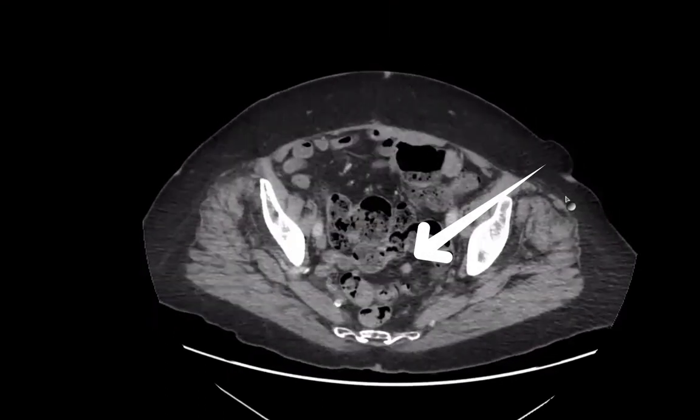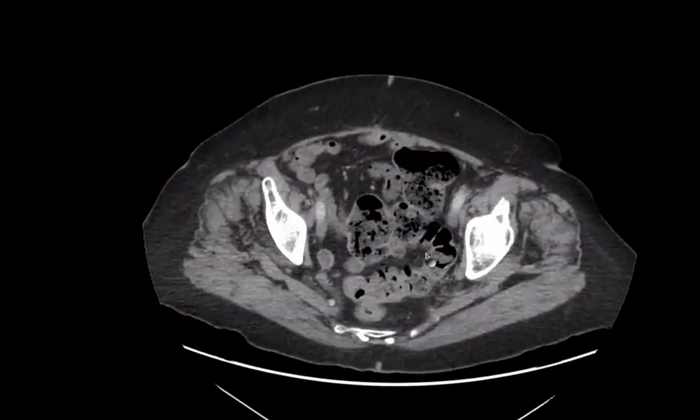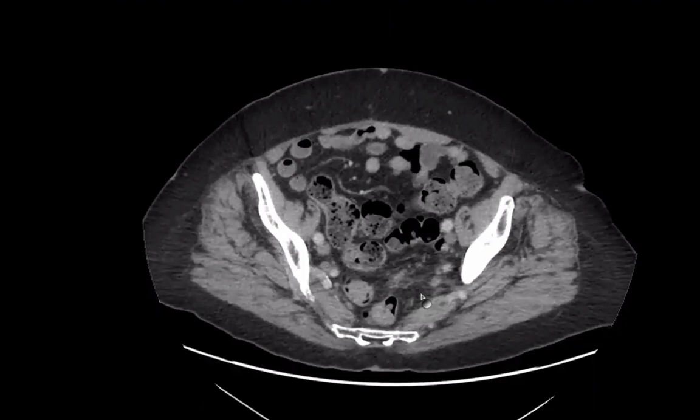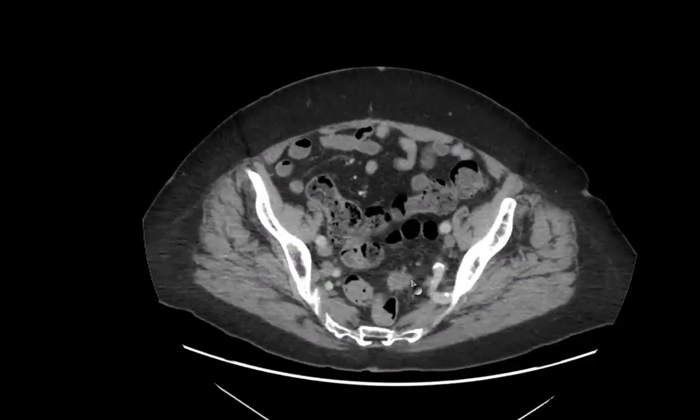There is one here. It's in the posterior aspect in the perirectal region. So you're pointing at this one? Yes, this one. Okay, now let me show you something. I'm going to go just 2 steps downwards. Can you see anything? There. Yes, exactly. This is a big deposit. This patient had a cancer operation somewhere else overseas and came for a scan, and he had this deposit.